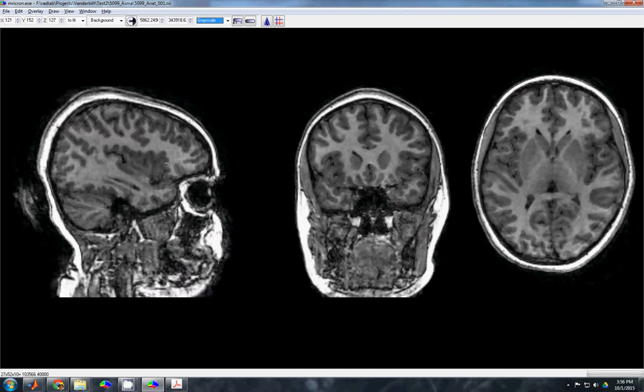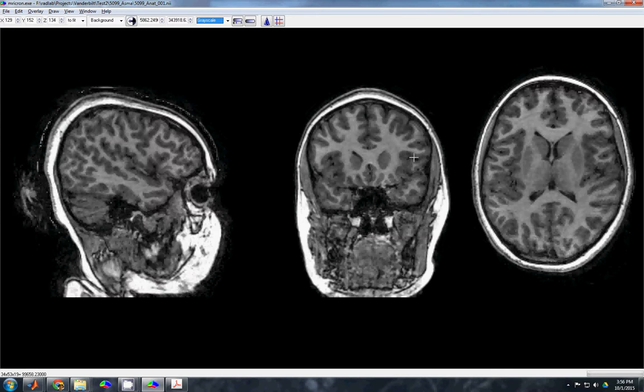And then we have a cluster right here at the front that's going to be our dorsal anterior and dorsal posterior. It's number 5 and number 8. Maybe we make an argument that there could be a number 7 in here. It's hard to see how this could be 3 regions. That this could be 2, 3, and 4, but definitely I could go 2 and 3, and I can kind of scroll back and forth to get a sense of that.